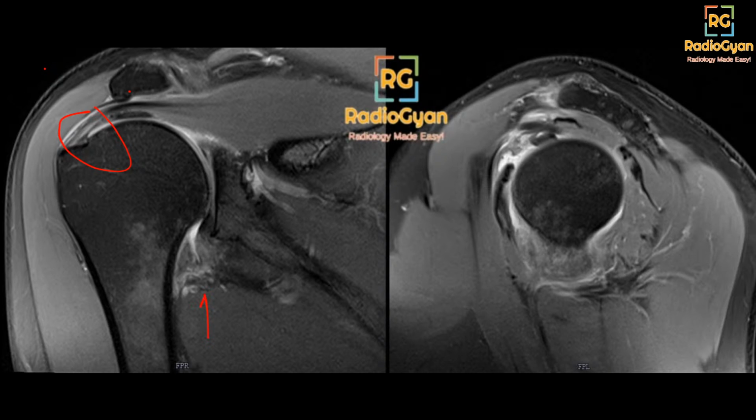So let's see. Some people have mentioned calcific tendonitis. I don't see any areas of blooming, although this is not a typical sequence. These are the areas where we are looking for the findings. A couple of correct answers, but I'll just wait for everyone to settle in. Supraspinatus tendinosis is a differential here, but we don't see T2, so this is not the finding that I am interested in. These are the areas that I want you to look at. So this area and this area.